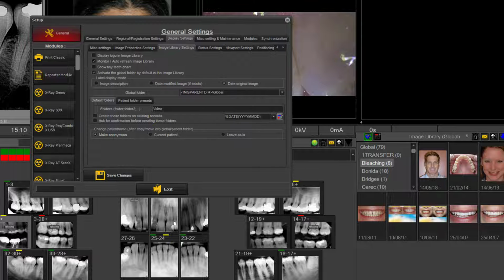Okay. Other than that, if we're going to be displaying the images, you want to keep the date of the original image. Again, up to you if you did want to have it modified. If you want to add in a date, like the date you're importing images into the library, you could have that option as well. Most people want to keep the original dates that are there.